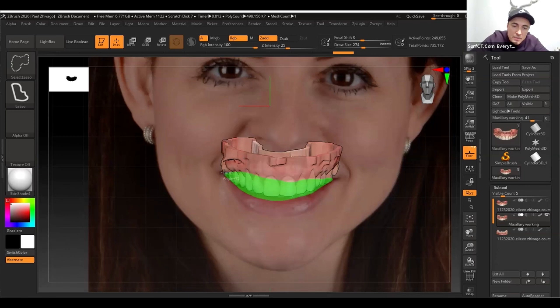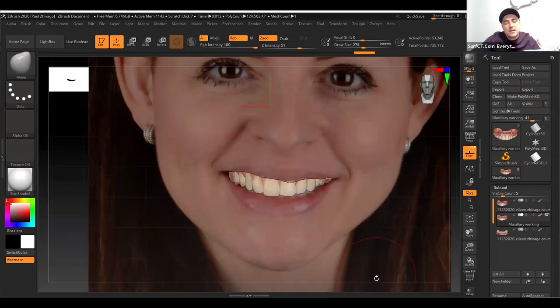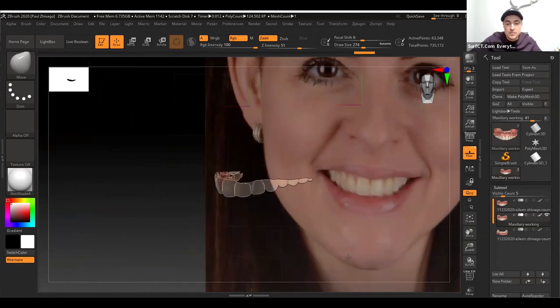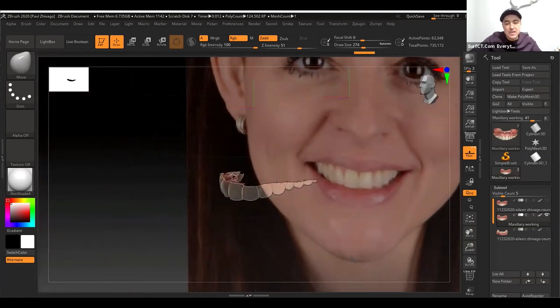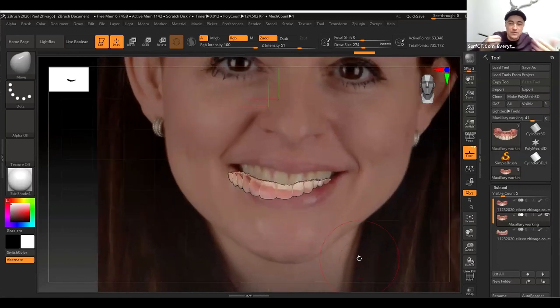And the green part means that I will keep everything visual that I selected, but everything else that I didn't select, it disappears. But it's not really a way, it's just a visual tool. So when you play around now with teeth, you can kind of estimate how close you are to the design that you want. So if I move this in space, it's actually just like the way it's aligned, that will kind of overlap correctly.